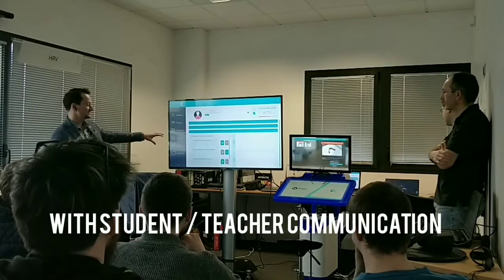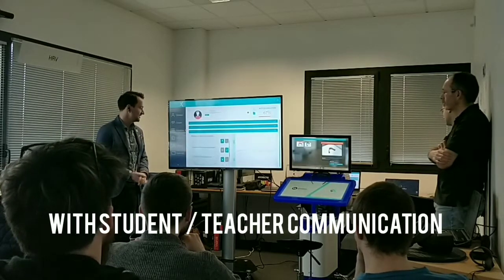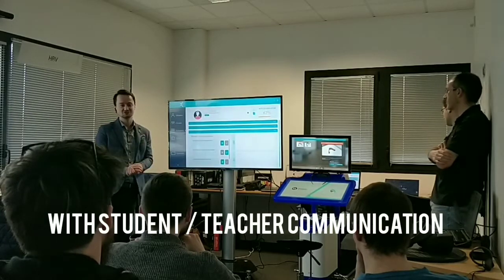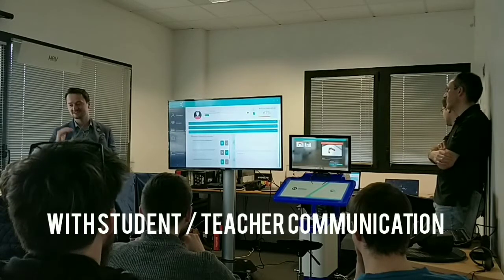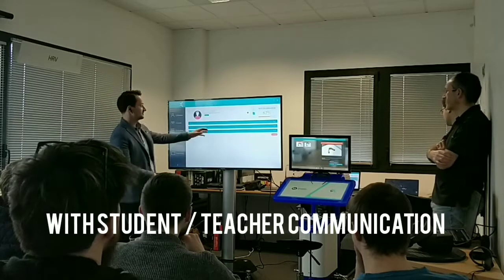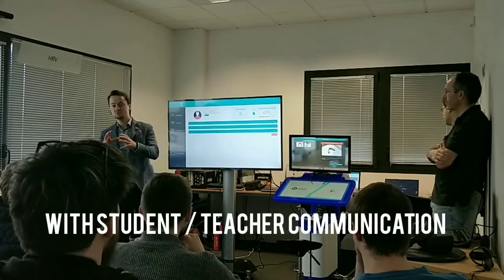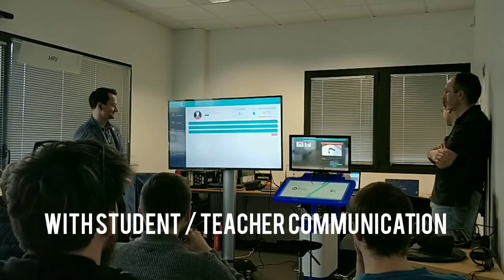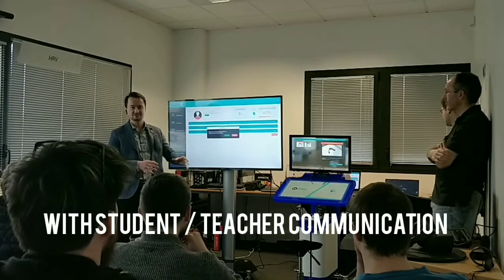And then with our self-assessment questions, we can see there's no comments left by the student, and if the teacher wants to, they can again leave a message to send to the student if they think there's stuff they could have done better or stuff they did fantastically well. And finally at the top, the teacher can actually give them a custom grade. So this matches in with the reporting for the university. So a B+ in this case. And then the teacher can go ahead and finalise this evaluation.